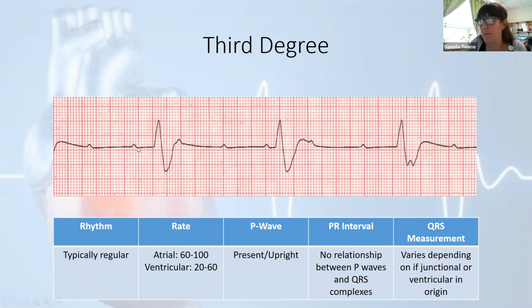Even if you said here, oh, maybe that's a first degree. When you look at this next one, well, that's too close. Oh, that one's far again. There's no heart blocks where it varies that quickly, right?